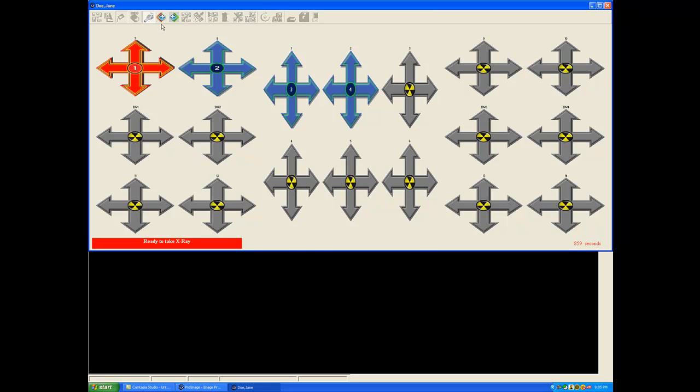Now we now have two additional active buttons here. Expose previous position, which is the same thing as doing a retake, and we can also expose the next position, which is another way of saying skip forward in the sequence. So these are very handy.